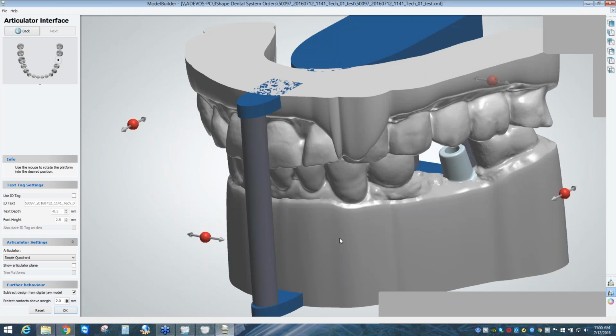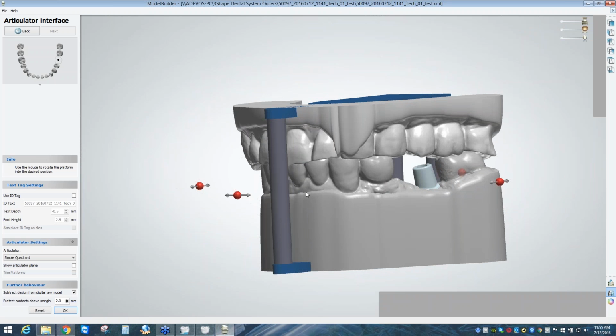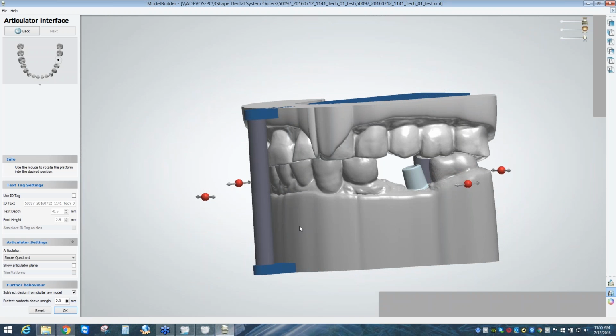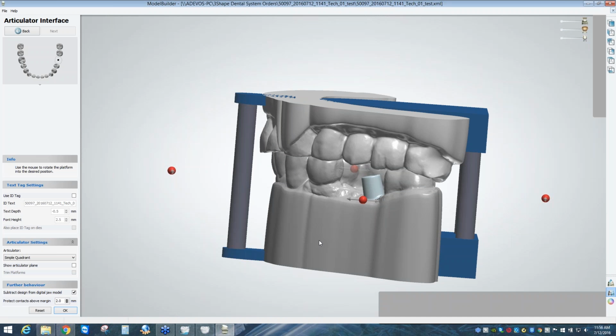That occlusal plane portion, usually that's where a lot of the more common issues could arise from when it's extending the edges of the scan to the base. So modifying the edges of your scan and resetting that occlusal plane can oftentimes get you past frequent errors.